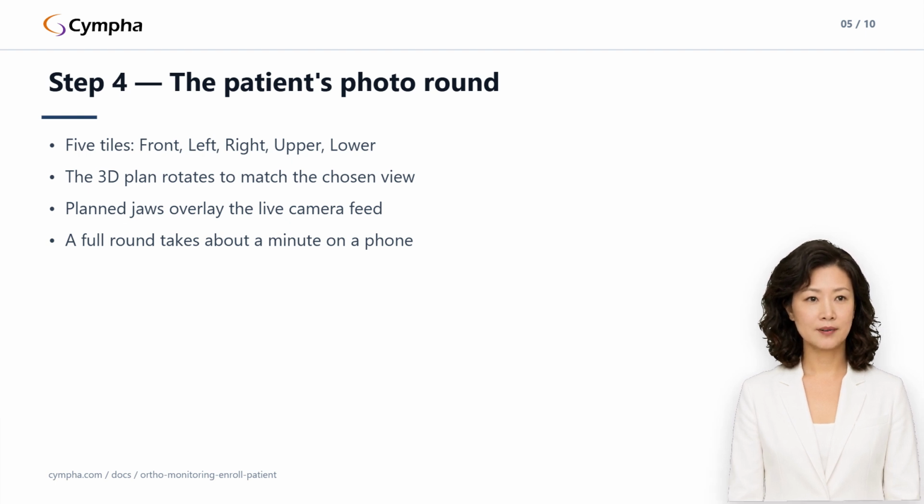That translucent overlay is the secret to photo quality. Patients who understand they're aligning to it produce consistent, comparable rounds.